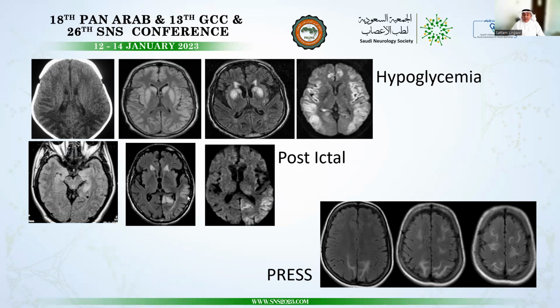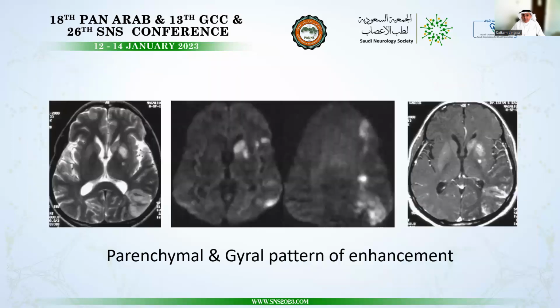Some of the cases, if not intervened with proper medical treatment early, may result in small areas of infarction and ischemia in the same distribution, resulting in areas of parenchymal gliosis. However, these are usually transient and they recover within 36 hours with proper medical treatment. Now, it is true that one of the giveaway diagnoses is that these lesions in ischemia are usually territorial, whether it is within the distribution of MCA or along the watershed distribution.